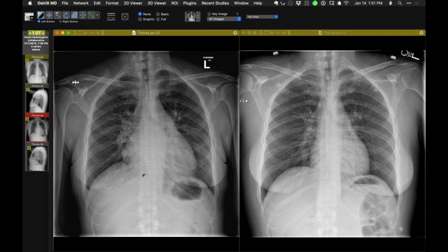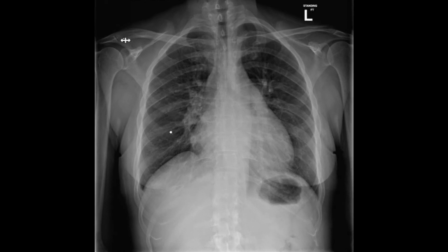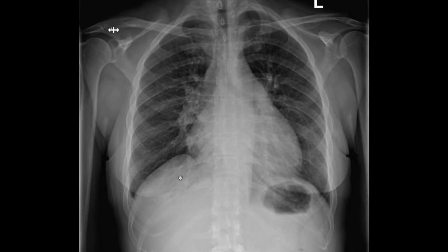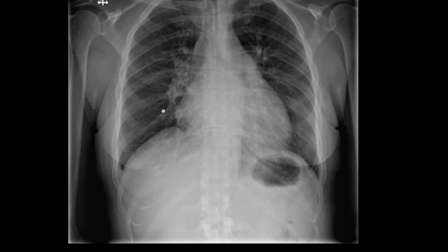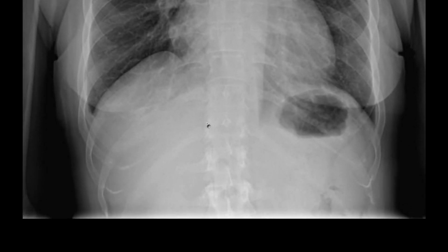This one I want to show you is something I look for but almost never see. The first time I heard of a particular term, and I'll show it to you now, was really in England, from the Brits. So there is a patient, I'll just put this one alongside, that has on the left-hand side some findings of interstitial edema.